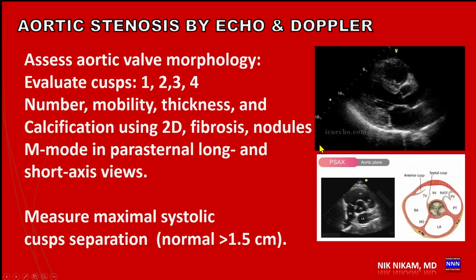And these are some of the things we are going to be looking at when we do an echocardiogram in a patient with suspected aortic stenosis.